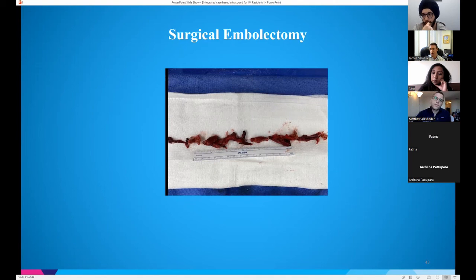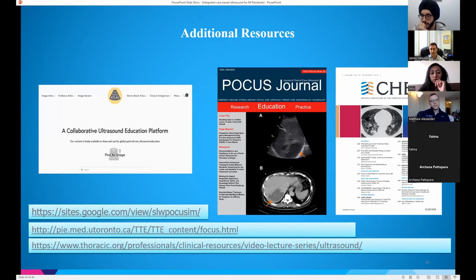So you could see how this patient was admitted with a diagnosis of pneumonia. Definitely could have been pneumonia, but ultrasound really helped to change the course here by looking at those lungs, looking at the heart, then coming up with a differential which made more sense, getting the diagnostic test that needed to be done, and then sending the patient where they needed to go so you could have these optimal patient outcomes, which really is what we're trying to teach here, right? How you can use this tool to better manage your patient, to deliver better, high quality care. And that's what it's really all about.